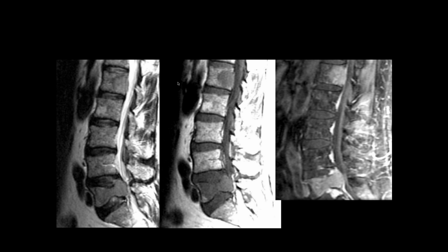I have a better discussion of this in the lumbar spine section, but there are a couple of things to look for to try to differentiate between benign and malignant lesions. And one of the most valuable is the posterior bowing of the cortex sign here. This is almost pathognomonic of malignant involvement. Most other diseases that affect the vertebral body, you'll get collapse of the vertebral body, like in compression fractures, but the posterior cortex will stay a little bit concave rather than convex like we're seeing here.